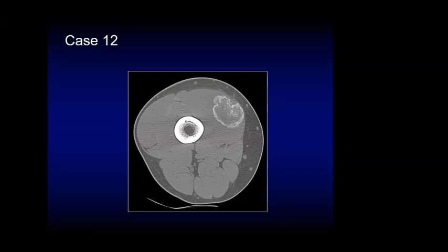And I think, in the external compartment, irregular border, in the anterior compartment of the thigh. Which exam is this? CT scan. Okay, so what is your suggestion about this?